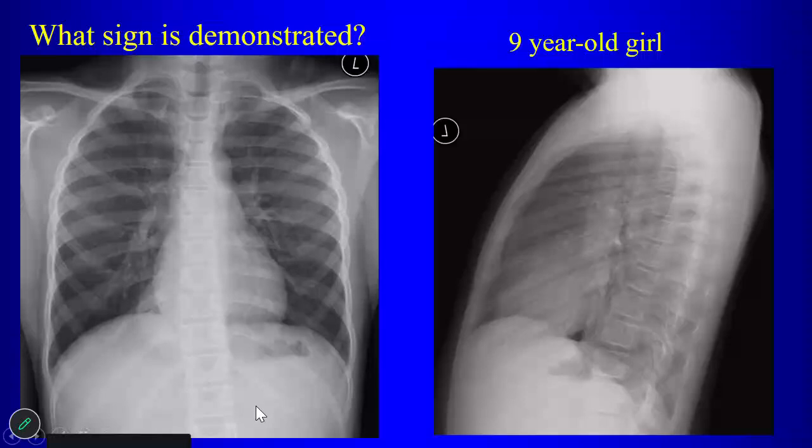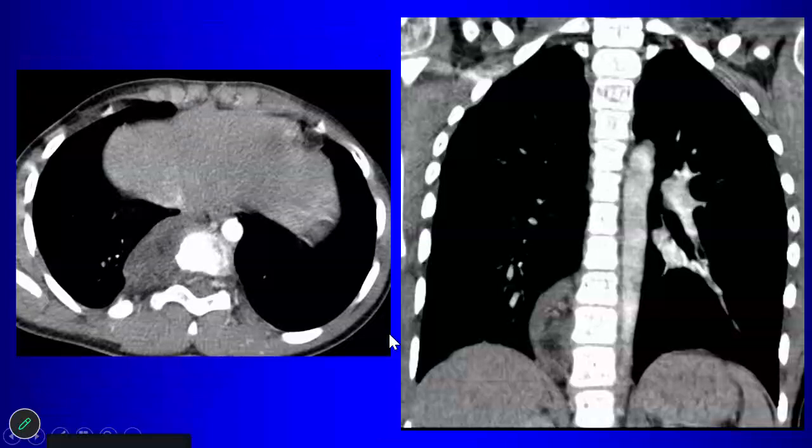So what is the sign called? Thoracoabdominal. This is called the thoracoabdominal sign, right? You can see the lateral border well below the diaphragm, so it's interfacing with air, okay? So posterior mediastinal mass, here it is on CT, right? What can we say about it? So there's internal fat and soft tissue. Yeah, got some fat and soft tissue or low attenuation in soft tissue. Do you notice anything there on this view?